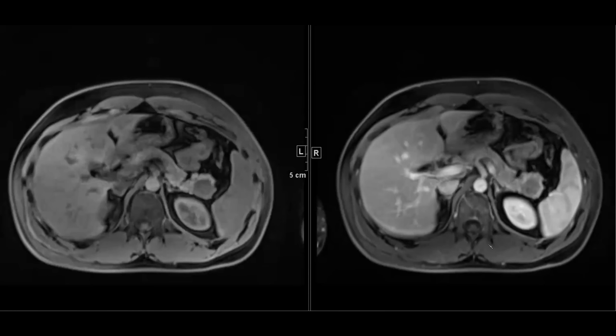So the take home point is that you can see them in males or females, but more in females, 90%. They can be solid when small, cystic and solid when large because they hemorrhage, and they're increasing in frequency because of their incidental pickup.